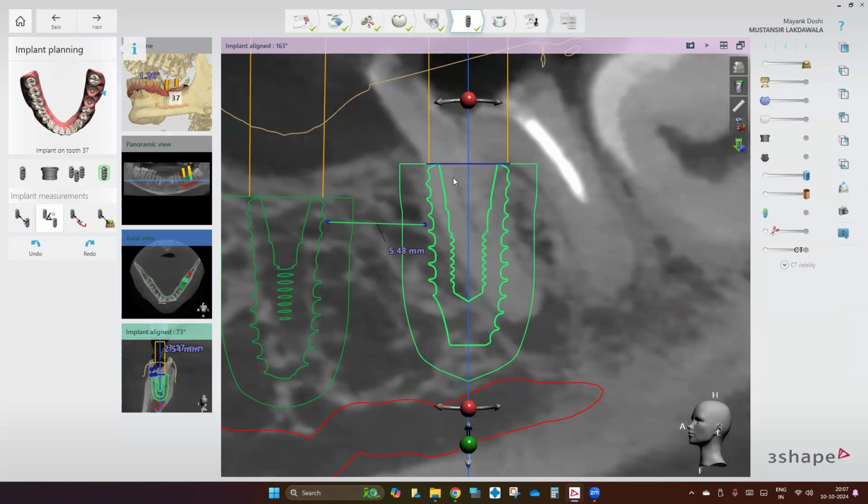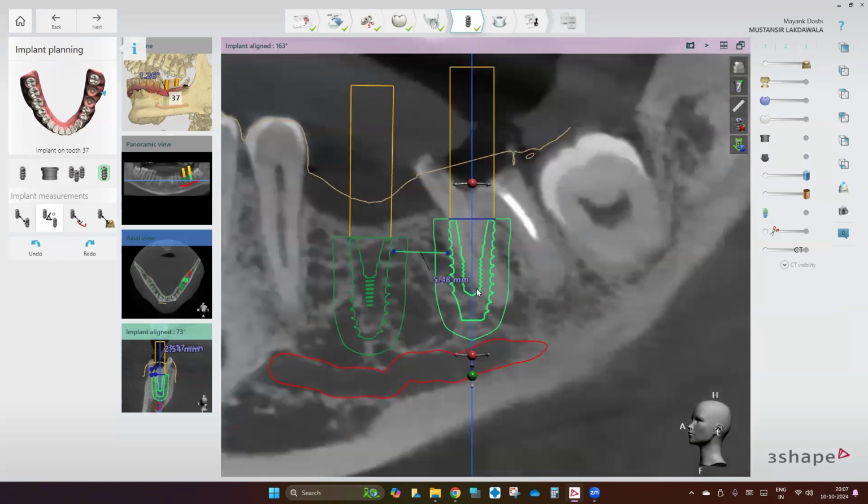So I want to conclude this part, I hope everyone gets it. Why did our planning come like this? One, it is independent of whether the patient's tooth is where, what is the direction of the tooth, where is the furcation, we don't care. We only care about the prosthetic center, and then we work backwards from there.